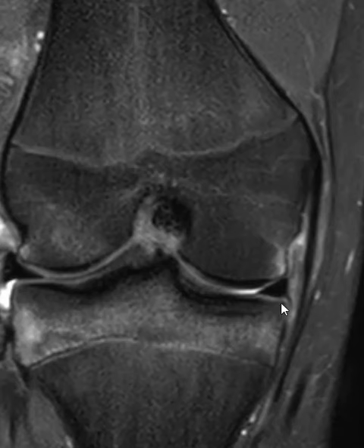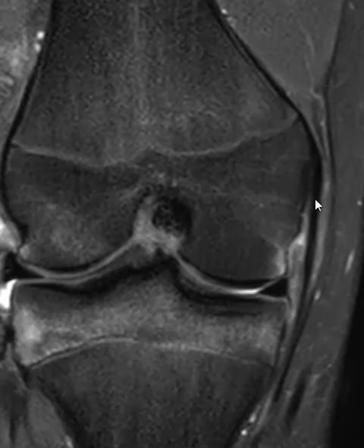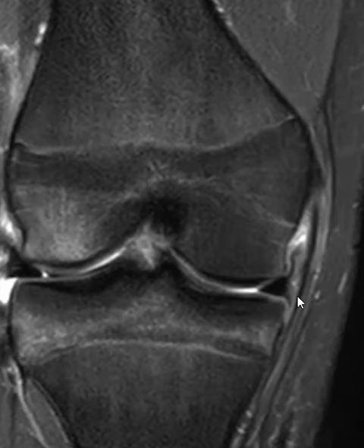So on this view here, we see there's brightness between the capsular surface of the medial meniscus body here. This brightness here is abnormal. And so we look to see, well, what is torn? Well, the outer fibers look nice and good, and then the inner capsular fibers are bright, so we know they are injured, and this is a possible meniscocapsular junction separation.